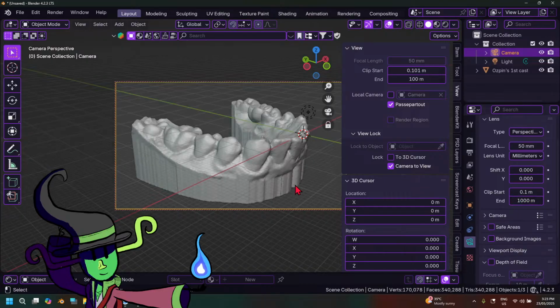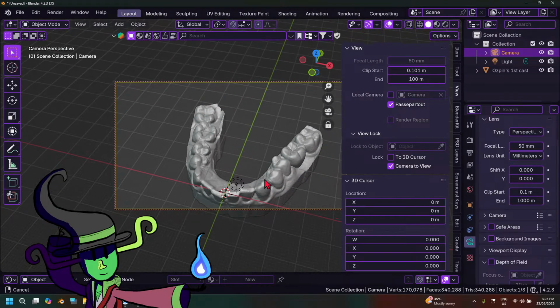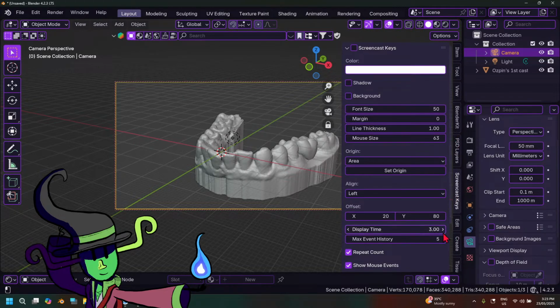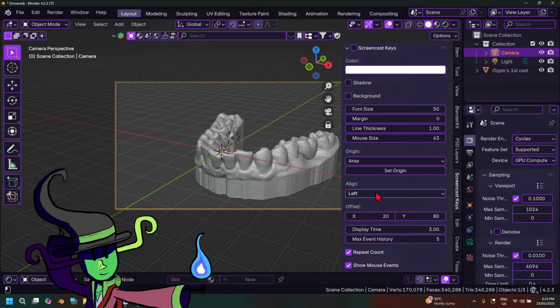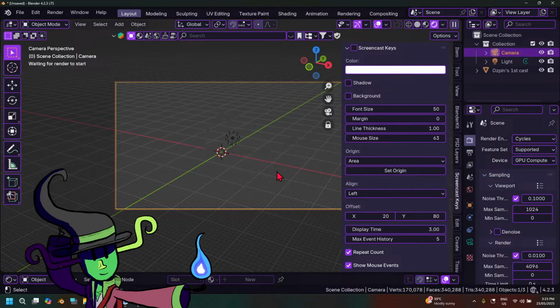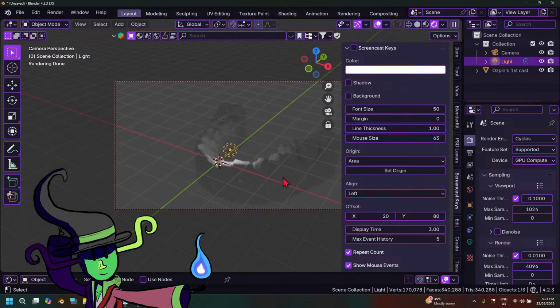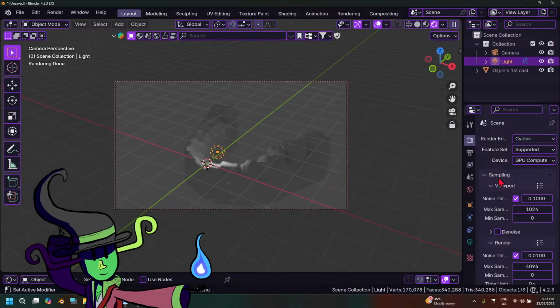Okay. There we go. So if you want to sell your patients on a procedure that requires you to use dental CAD, I suggest you go open up a software like Blender. Blender has a thing called a render engine that would make your models much more realistic. If I go down to viewport shading here, it will turn your kind of ugly cast into a more realistic 3D model here.